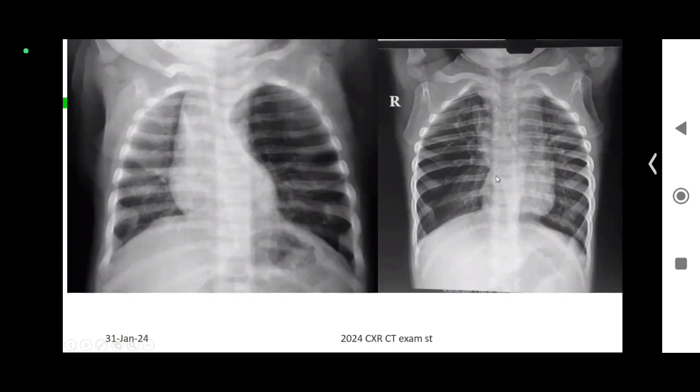If there is an upper lobe emphysema, there will be compression of the left lower lobe. Now, in the same way, look at the right side X-ray. You are able to see there is something here compressed. You are seeing more air in this aspect, and again you are able to see more compressed lung on the upper aspect. This is a congenital lobar emphysema, right middle lobe. Just tune your eyes to looking at what abnormality can be there. This is just an eye opener. Don't think that you have not diagnosed it. You are in the learning process. Kindly learn. Don't feel otherwise.